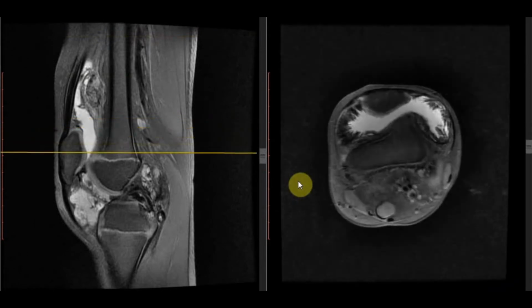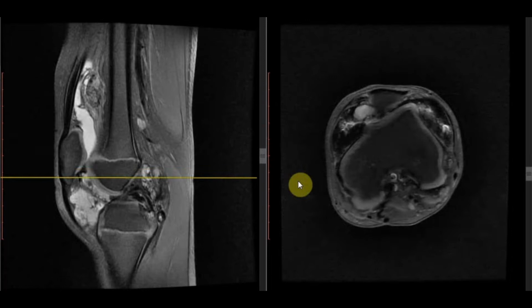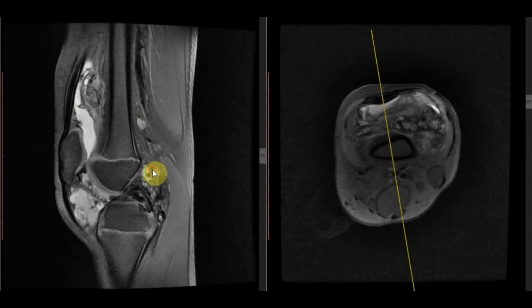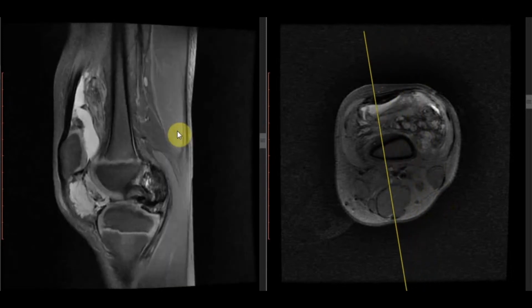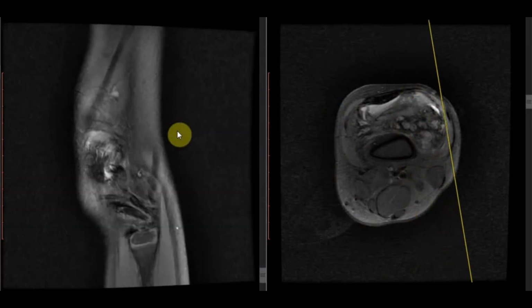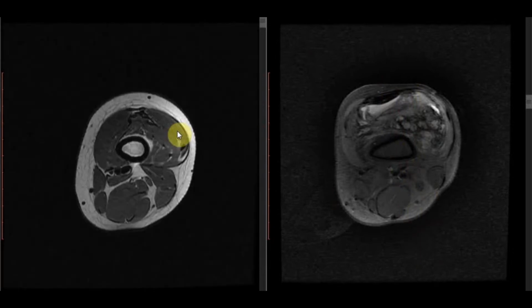We can also see the axial plane and see how beautiful the synovial lining is appearing. And there is presence of hemosiderin contents within the synovial lining. There are no obvious erosions in the present scan. So actually PVNS presents with multiple pressure erosions in the underlying bone, but the pressure erosions are not seen in this case right now. We also have a contrast sequence.